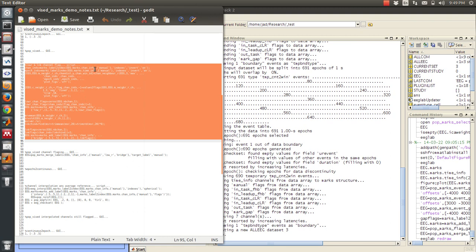So what I have here is some code that goes through and checks the correlation coefficients between channels, and then determines from that whether a channel is a bad signal and that it has an unusually low correlation coefficient to its nearest neighbor. And then it also determines whether or not a channel is likely bridged to its neighbor by finding unusually high and unusually consistent correlations to its nearest neighbor.